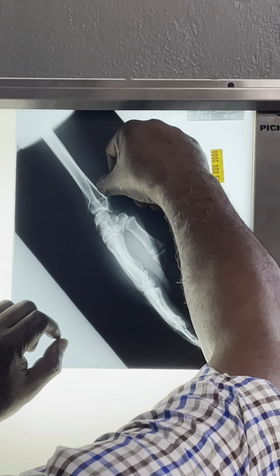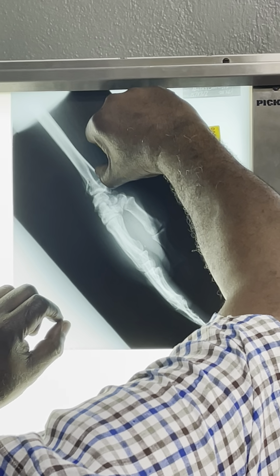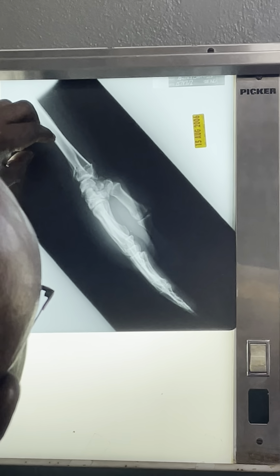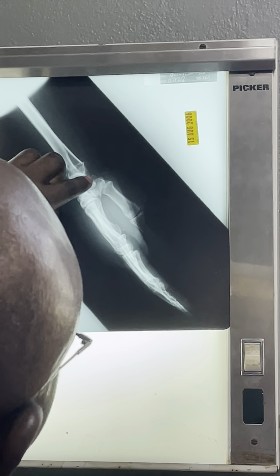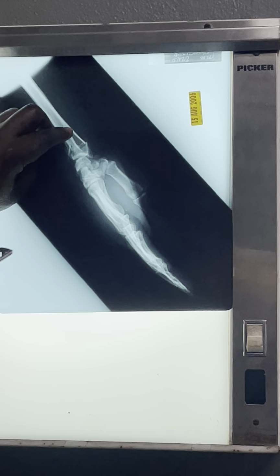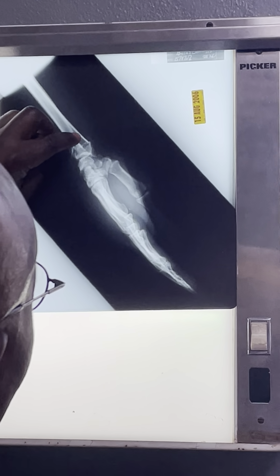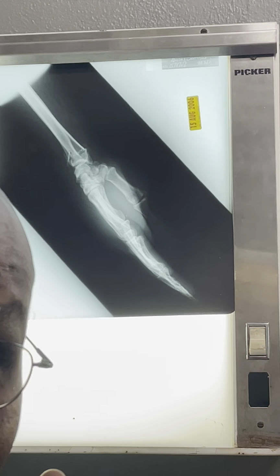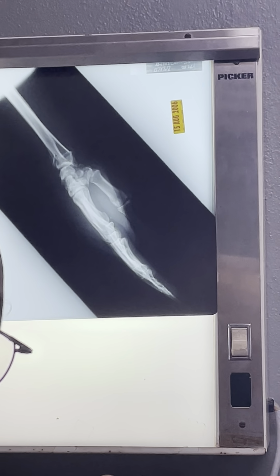So again, here's the proximal fragment, the end of the proximal fragment. See the cortex ends there? Agree? And in fact, as I said to you before, you see the cortex of the radius going there, but you don't see the cortex of the fracture. That's one of the cortices of the proximal fragment. You see that? You don't see it down there. What it tells you right away, I taught you all that principle as well.